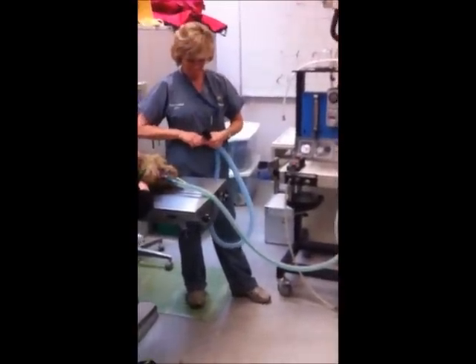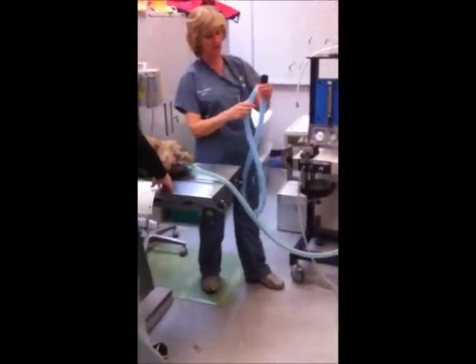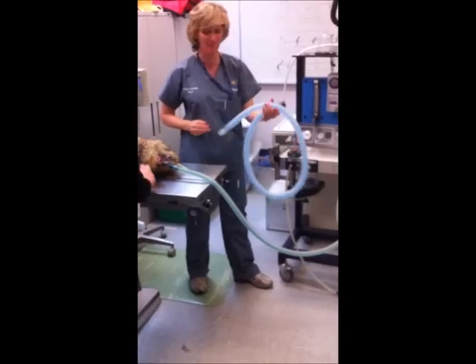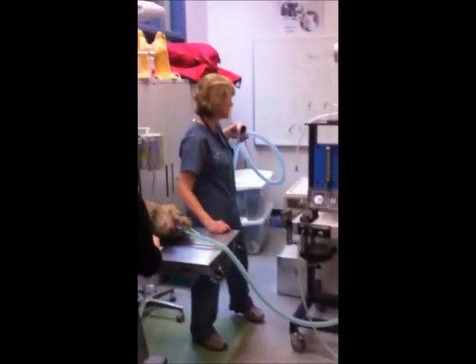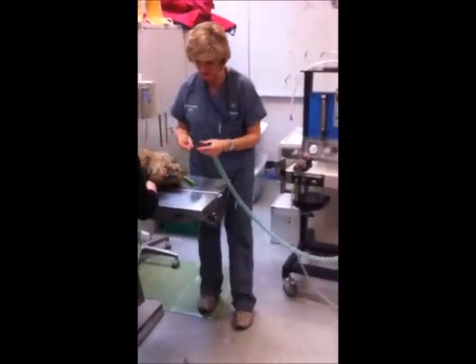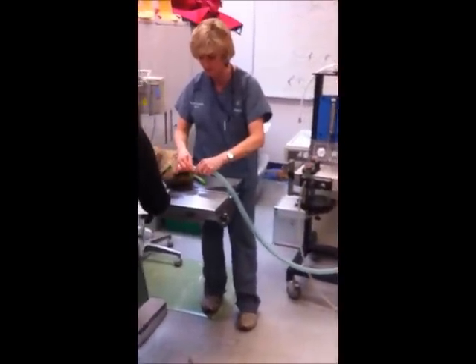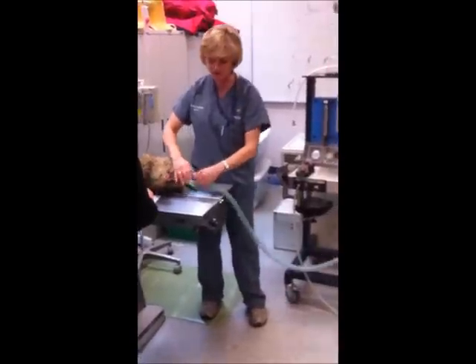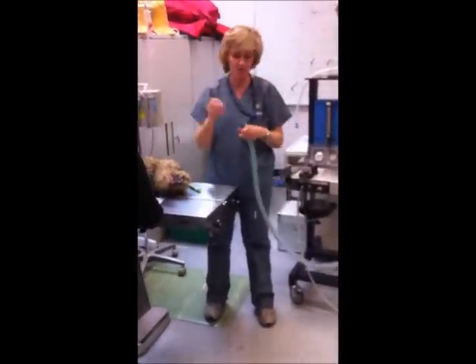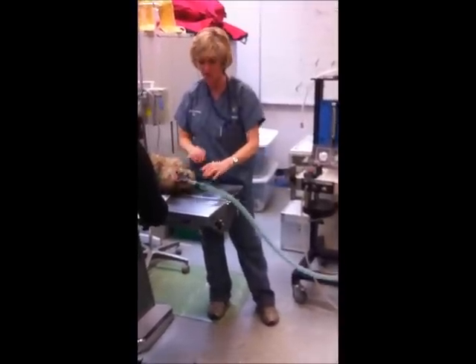Okay, good. I'm going to just ask you guys this before I go. I find when students are doing it, you really like to plug things in well, and I have trouble getting them apart sometimes in between tests. So just don't feel like you have to really push it in. If it falls, don't worry, I'm not going to worry about that. But I see some students going, well, then I have to go get it out. Just absorb it. You don't have to push it that way.